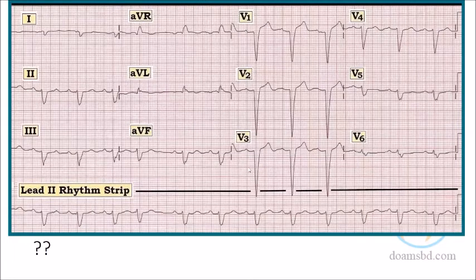And any fractionation here? You understand the fractionation? Notching. Is there any notching? You see? When zoomed, it can be seen a little, sir. So this is the notching. The typical notching is here. You see the notch? You understand the notch? Right? Yes, sir. Notching is there. So notching is very typical for block.